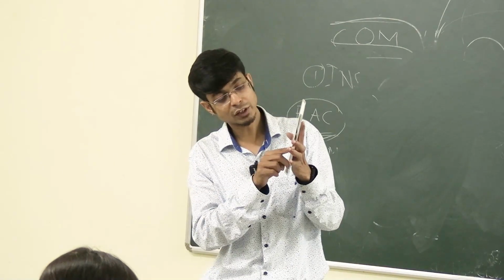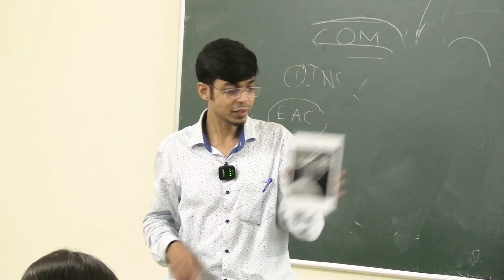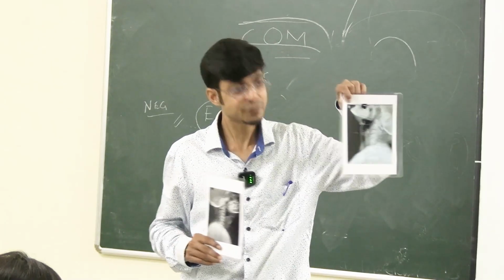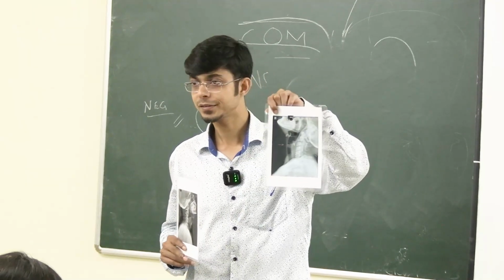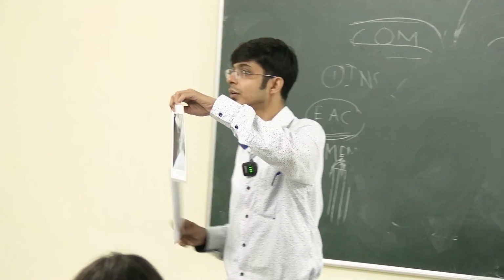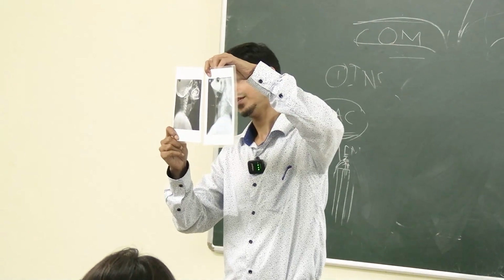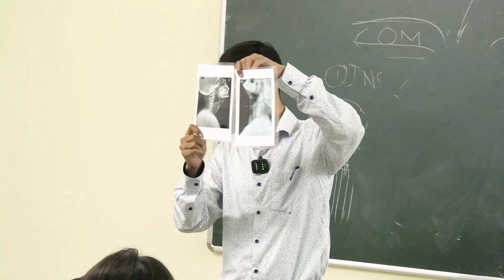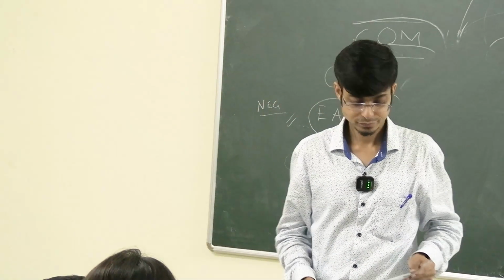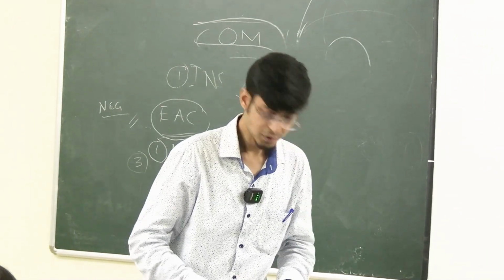There's some ossification of the cricoid cartilage. Apart from that, there's no definite foreign body visible. Okay, but in the other two, you may not appreciate the abscess as much. There is inflammation, but you can appreciate the foreign body in there. Okay, see the differences between these two. Okay, so how is the esophagus? So clear about this one.